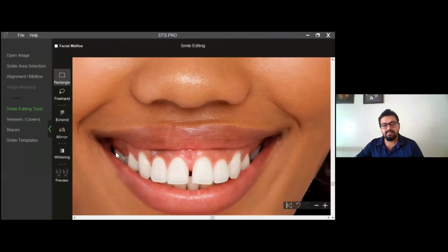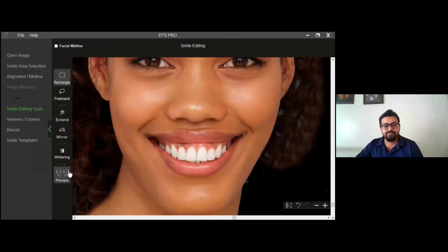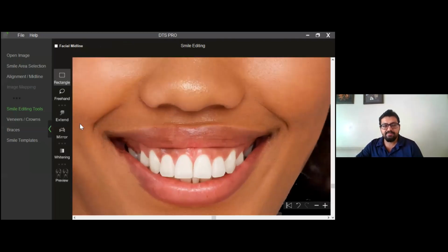And then, of course, we can do the same sort of simulation that we had done in the first case. I'll just move my segment of teeth to motivate the patient and explain how the whole thing can be. A little bit of gummy smile correction can happen with some amount of crown lengthening on all teeth. It could happen with a little bit of adjunctive treatment at the end of the orthodontic phase, but that can be tackled right in the first visit.